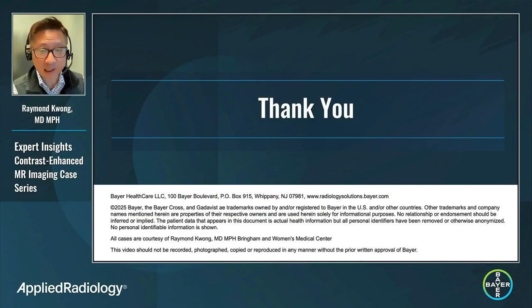Thank you for reviewing these case studies with me today. I hope you find it useful to see how we use Gadavist imaging to assess stress and rest CMR myocardial perfusion and late gadolinium enhancement in adult patients who present with known or suspected coronary artery disease.